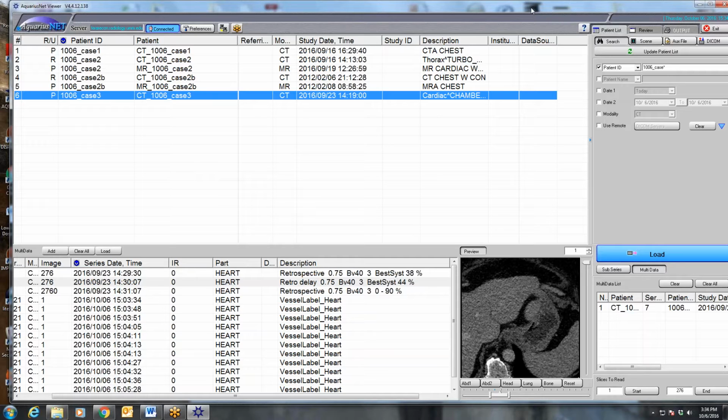Okay. He's got this aortic wall thickening that goes from his ascending aorta through the arch and to the descending aorta. It tapers off somewhat in the abdomen, but there is still localized wall thickening in the lower abdominal aorta and even going out into the iliacs. This arteritis pattern actually coats his right coronary artery as well.